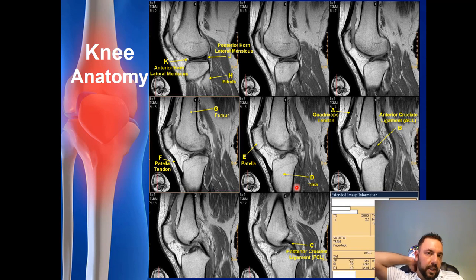Very often you're going to see anatomic slides based on T1 or proton density. How do I know which is which? Take a look at the TR and TE. I'll give you a second to determine if this is T1 or proton density.